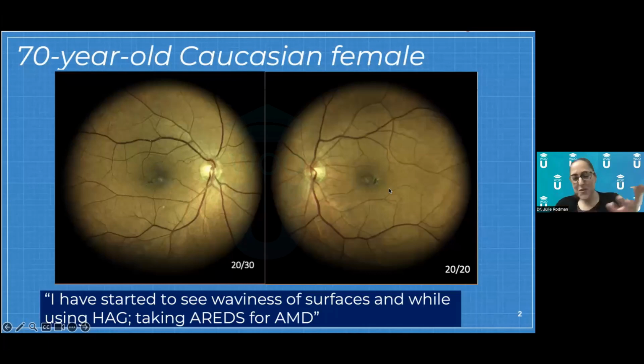So I know you already saw the next slide, but if you have a thought of what I'm going to say, when you hear the term right-angled venules or diving blood vessels temporally, this correlates with something called macular telangiectasia. And I'll tell you that macular telangiectasia is oftentimes misdiagnosed as AMD because patients can get pigment plaques in AMD, and they can get these lighter areas that diagnosticians think is drusen. So we have to be careful. Why this case is in this presentation is because OCT is going to be the diagnostic modality that's going to tell us that it's not actually AMD, but MacTel.